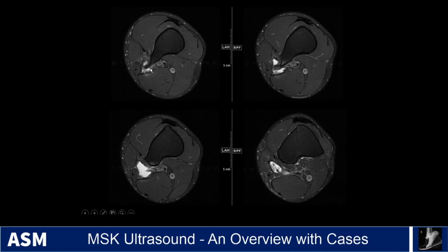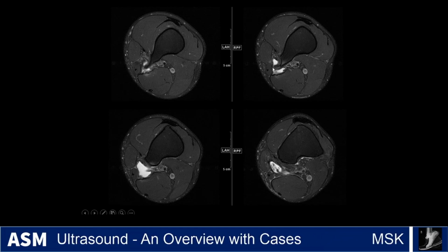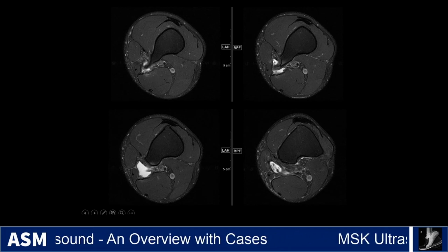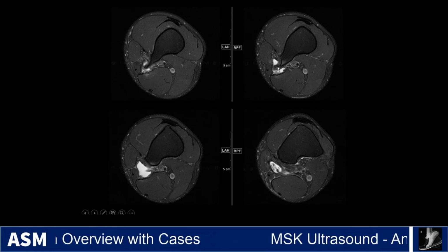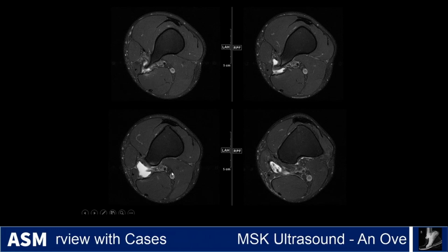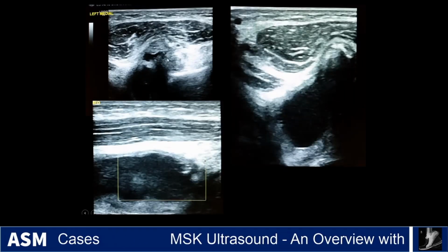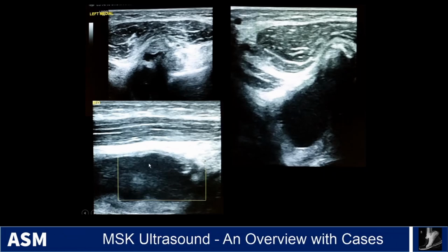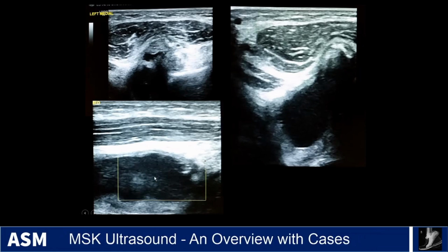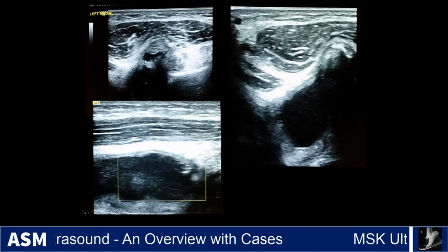They had this other exostosis on the other side, and this, again, PDFS hyperintense material around here, not really with a convex margin. It sort of has this angular appearance, like it's not really space occupying. But without contrast, it's kind of hard to tell what we're looking at here. And so here's the corresponding ultrasound, and you can see that there were areas, this is with the color, so there was no flow but it made it look a little bit noisier, but most of it looked like this anechoic material here.